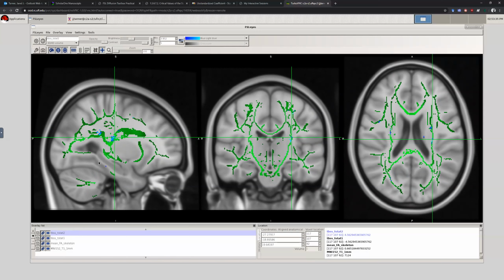And so this is what you could do. You could do a screenshot and submit this for homework. You could do a built-in screenshot. It may or may not work. We've had some issues with that. But if you certainly do a computer screenshot, you would have this. You can turn off the crosshairs if you want it cleaned up a little bit.